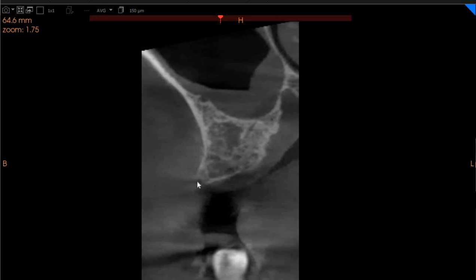Moving to the edentulous area in the first molar region, this region is edentulous. Here if we look at the ridge, it's 11 millimeters wide at a slight slant towards the palatal and we've got approximately 10 millimeters of height. So an implant placement in this region is definitely possible.